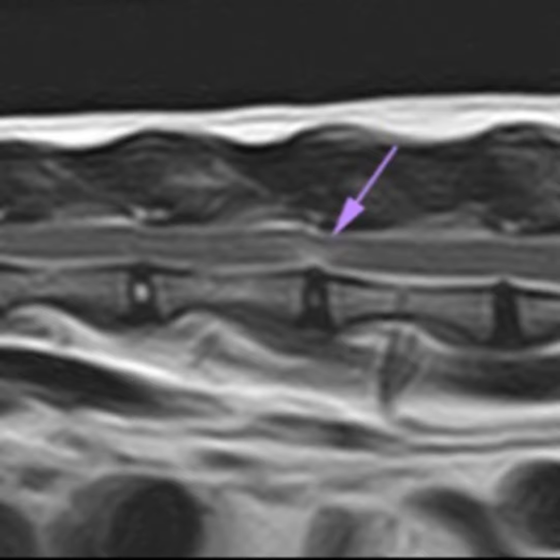The MRI of the spine was performed using either low or high field MRI, and the MRI study included at least T2-weighted and T1-weighted images on the sagittal and transverse planes. For the MRI findings, we classified disc herniation according to the type as disc extrusion, disc protrusion, acute non-compressive nucleus pulposus extrusion, and intradural intramedullary intervertebral disc extrusion.